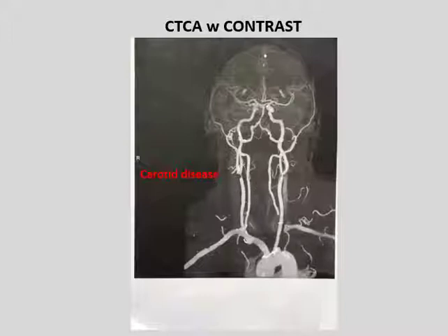Notice how tight that lesion is. Occlusion of that vessel altogether, which wouldn't take much, could result in a stroke, although there is collateral flow around the brain by the circle of Willis.